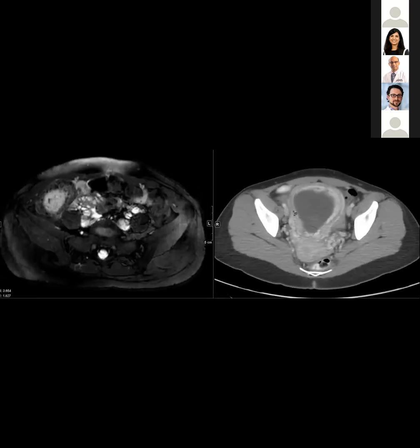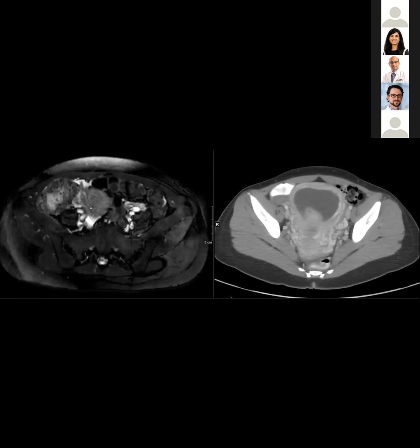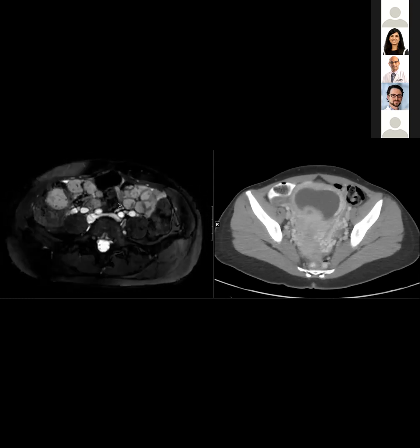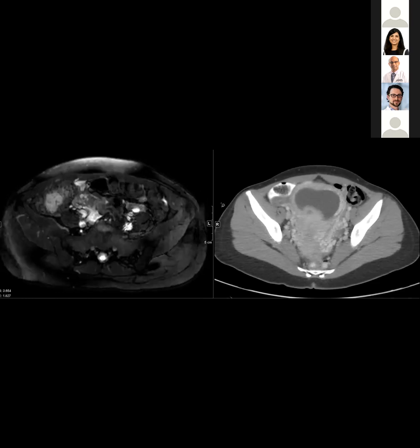But the patient was symptomatic on the MRI too, right? Yeah, the patient was symptomatic. The MRI was done 2 days before the CT. So she's been symptomatic enough to be admitted to the hospital and stay for 2 days, and then for them to just go for CT because MRI would not be conclusive. So is the thought that the gonadal vein thrombosis developed during her symptomatic period within these 2 days?